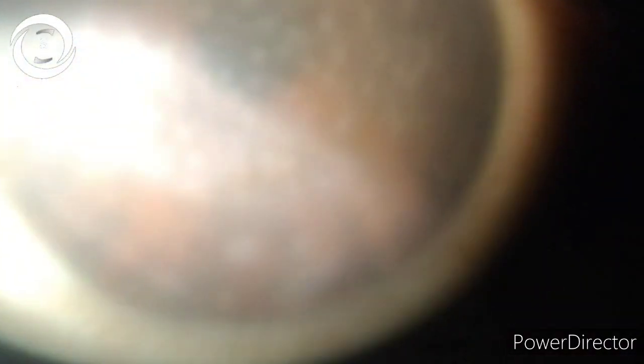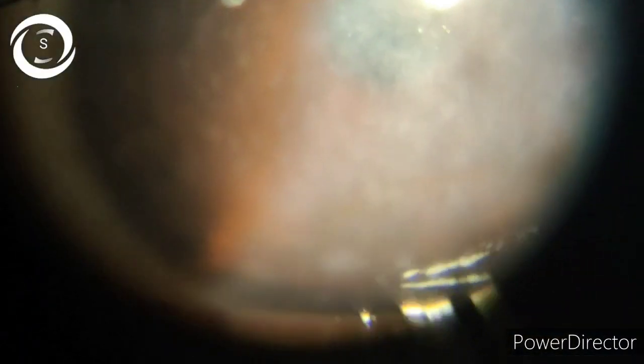Now let's solve this challenging case which I posted a few weeks back, and I got a lot of comments. Izzat commented that a differential diagnosis could be superficial punctate keratitis, acanthamoeba keratitis, nummular keratitis. Himanshu Singh called it a coarse herpes punctate epithelial keratitis. Maqsood Maula called it nummular punctate and stromal keratitis, again of herpes simplex variety.